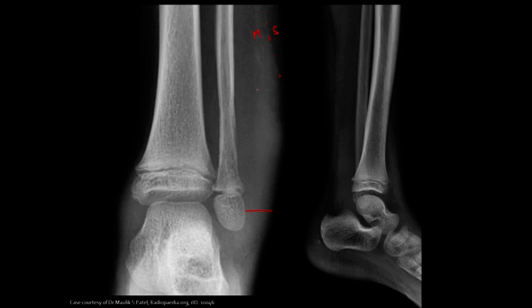If we look to the deeper tissues, the bones, we can see an area in the cortex where it's not as well ossified, but there's more destruction there compared to the more proximal regions. Internally, we have some more permeative osteolysis in that region.